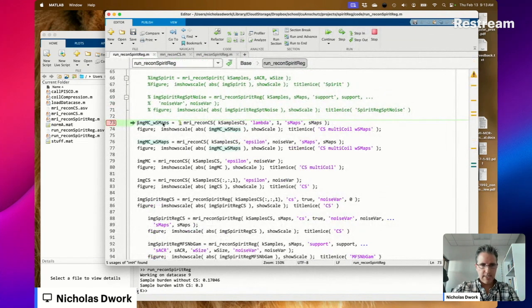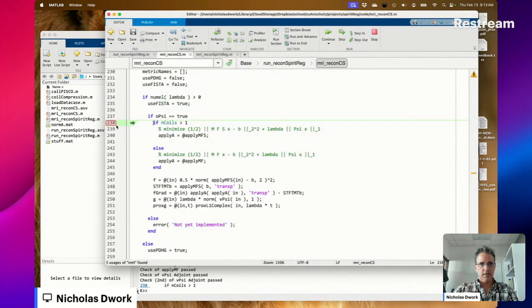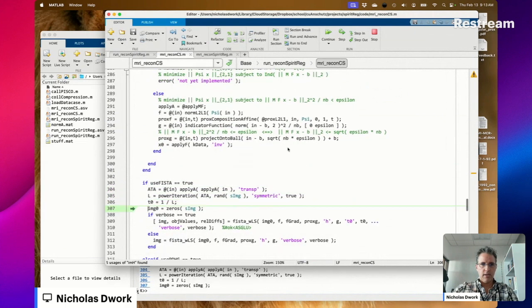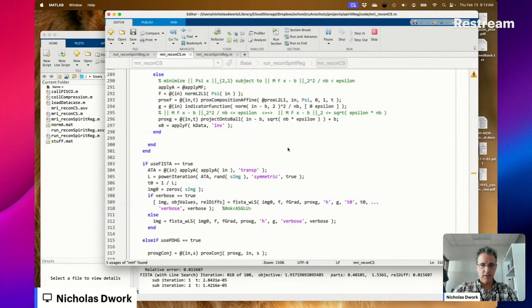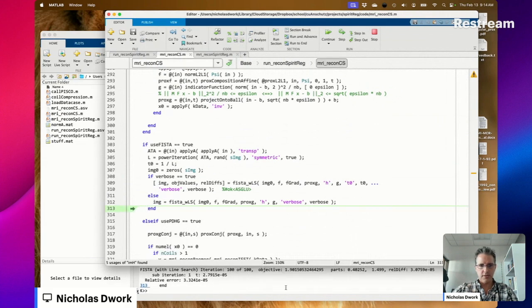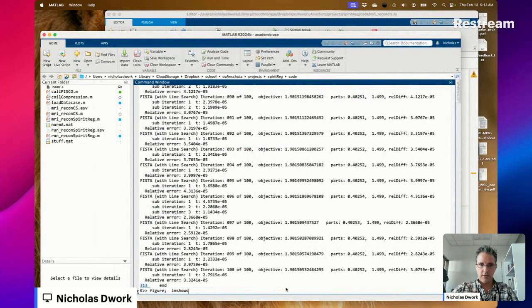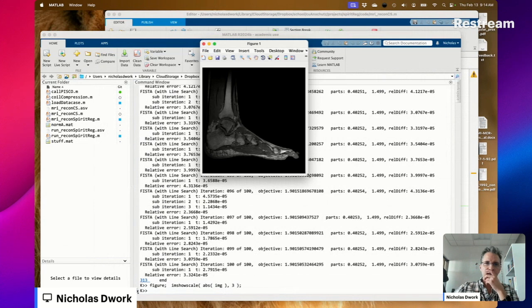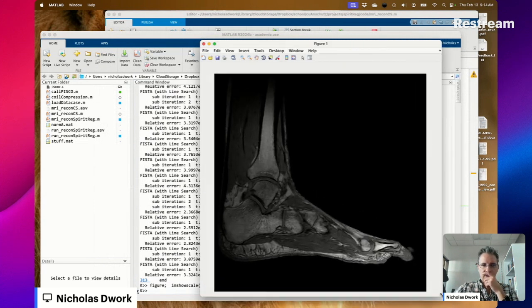We got this stellar result, you might remember, not that long ago, using lambda when we were doing SPIRiT regularization. Now, is that because we were doing SPIRiT regularization? Fista is so nice. When you can solve something with Fista, solve it with Fista. See, that is a super nice result, right?